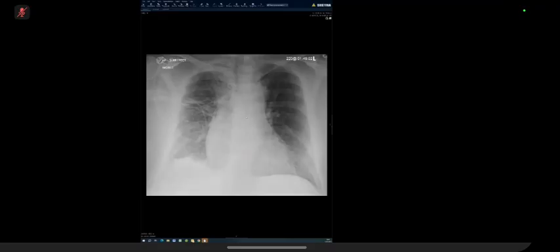When you describe it, start from the lungs, start from the most obvious abnormality. Don't start with the pneumothorax, pneumomediastinum bit, because that may be a thing you do in rapids maybe, but not in a VIVA description. I think it's one trick sometimes we use just to make sure we don't miss a life-threatening abnormality, but saying it doesn't seem as smart as we want ourselves to sound like.